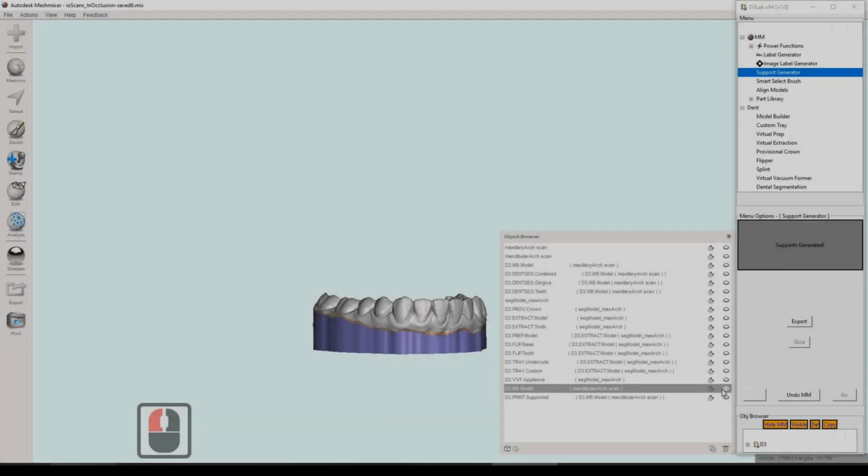Hello and welcome to the last video in a series and playlist dedicated to all of the individual tools and features that are included in the initial release of D3Lab. The intention of these videos is to give people an honest idea of what to expect for what the software does, how the software works, and what to expect as a general outcome for all the different tools and features that we looked at in the different videos.